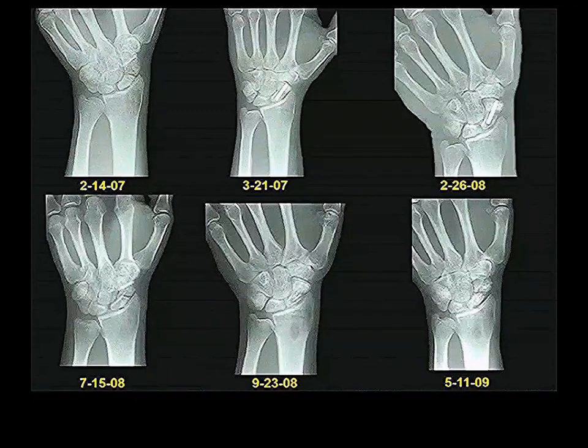And the radiologist took a look at this proximal fragment here. And I agree with the radiologist. It's denser white. It's more radiodense than it should be. Now, when bone starts to die, peculiarly, it collapses and it gets more radiodense. And this is a sign of what's called avascular necrosis. Avascular necrosis is death of a bone due to its loss of blood supply. And it usually shows up then as a more radiodense structure due to collapse than it was before.